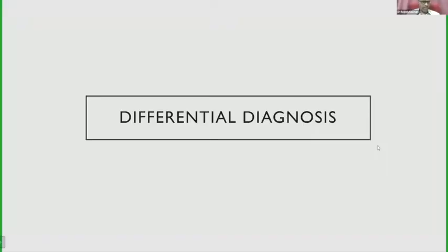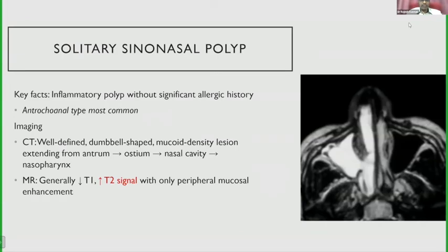So what do you think after looking at that? We can go to the differential diagnosis. Solitary sinonasal polyp can be a differential.